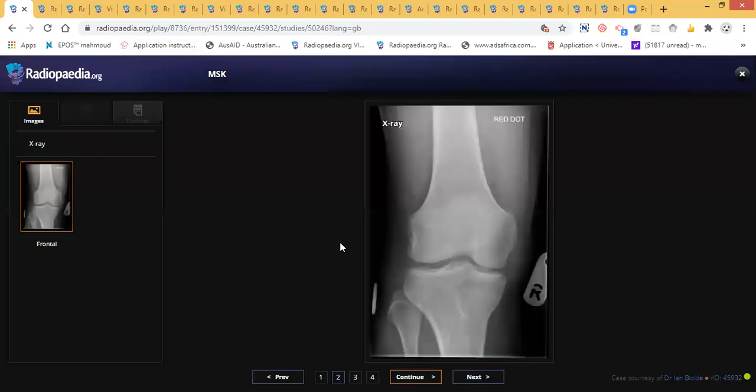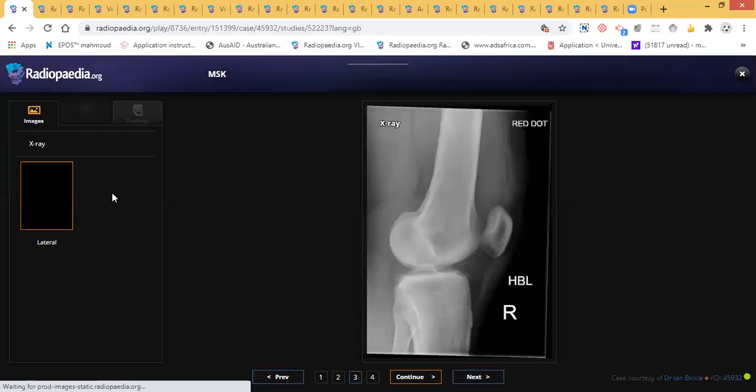They like this very much in the MCQ, short questions and long questions, but I think it can come more as short questions and also MCQ. Exactly. So when you find one fragment here beside the lateral tibial condyle, this one is a Segond fracture, and sure he will ask you about ACL tear, what you would like to do after, or what this represents.